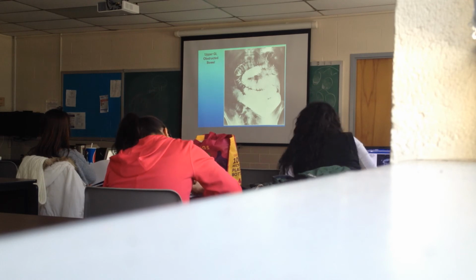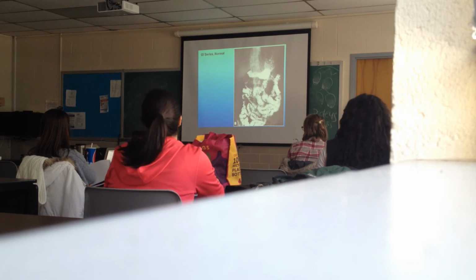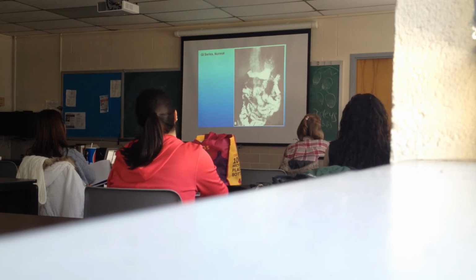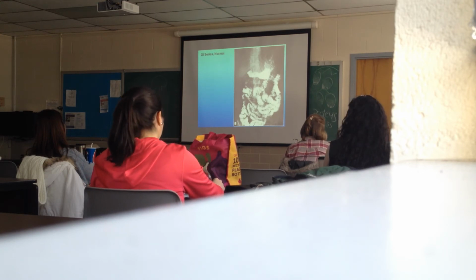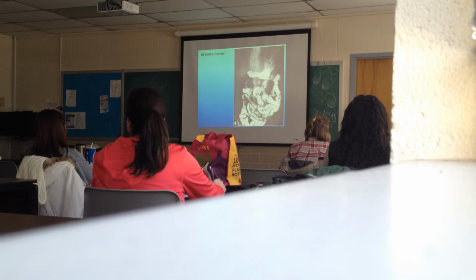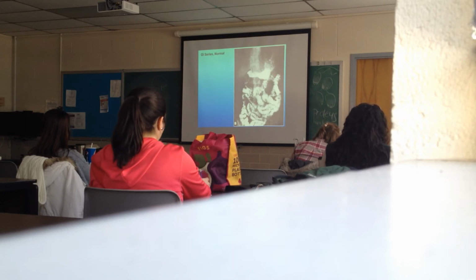On the previous normal one, why did you see large bowel, like the transverse colon? So this was probably a barium swallow. Eventually the person will pass it. Here it's small bowel, yeah. So you took the X-ray before it showed up in the colon. And you'll have to time it well, because if you really want to see the stomach and upper GI, otherwise you'll have to keep administering the barium.